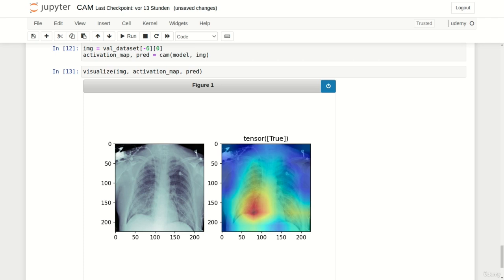Wow, this looks perfect. We can beautifully see how the somewhat foggy region of the X-ray image has a large impact on the prediction of the network. This happens in both the left and the right lung. We can also see that the outer parts of the image, as an example the shoulders or arms, don't have any influence at all. Our trained classifier did not just tell us that there is a pneumonia in this image, but also where we can find it.